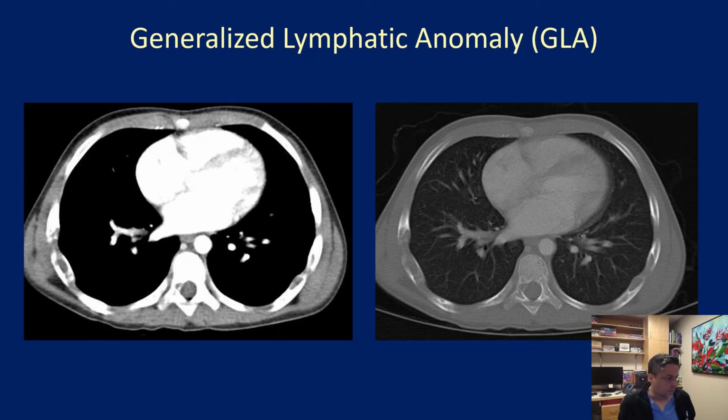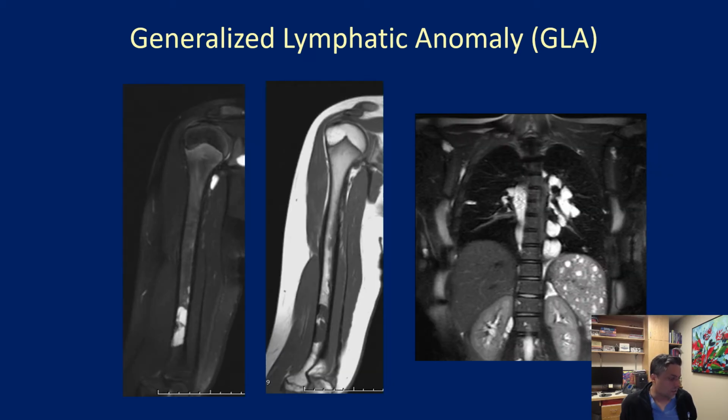These axial CT slices of the chest in a different patient show evidence of well-defined punched-out lesions, again with mild expansion, but no evidence of periosseous or perivascular soft tissue disease. On the MRI, these are seen as well-defined lesions that are T2 hyperintense, and while may cause endosteal scalloping, there is no evidence of active cortical destruction and no evidence of periosseous soft tissue disease.